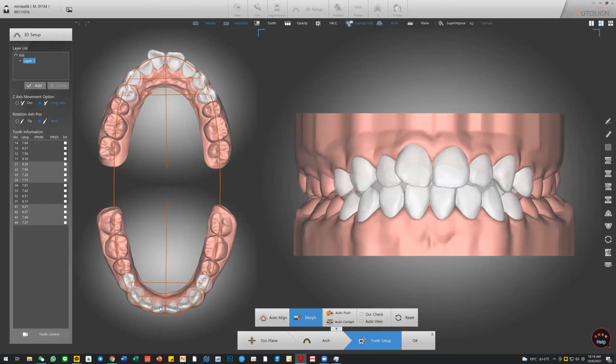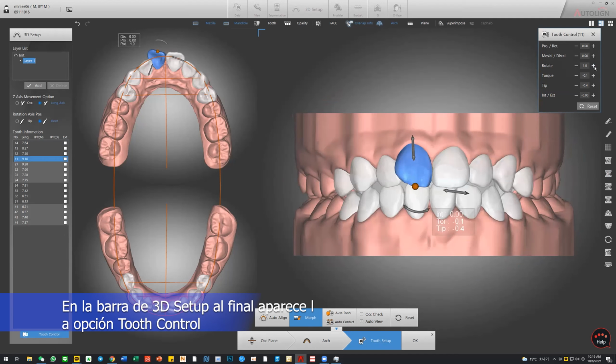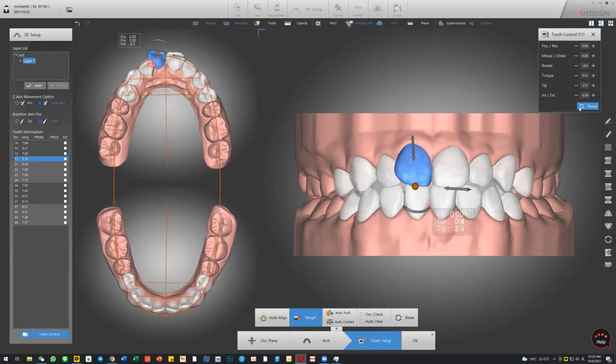Move it with the minimal value, or you can just input the value that you want to rotate them as you desire. You can start with your digital planning, but first, let me show you the staging function of the software.